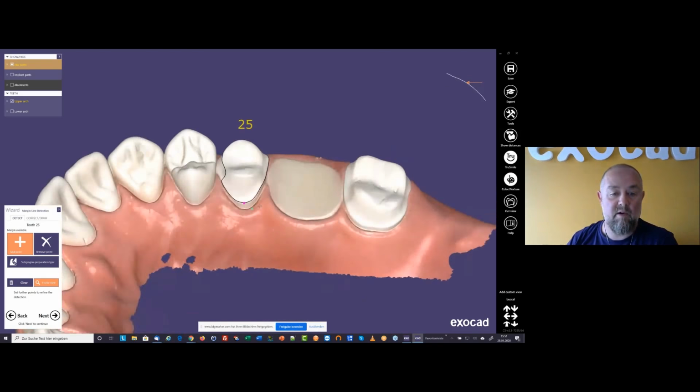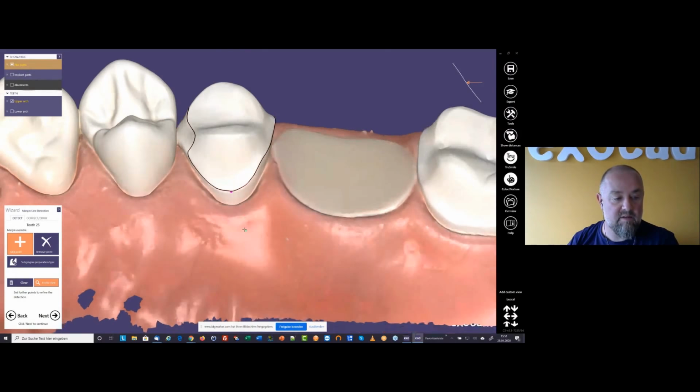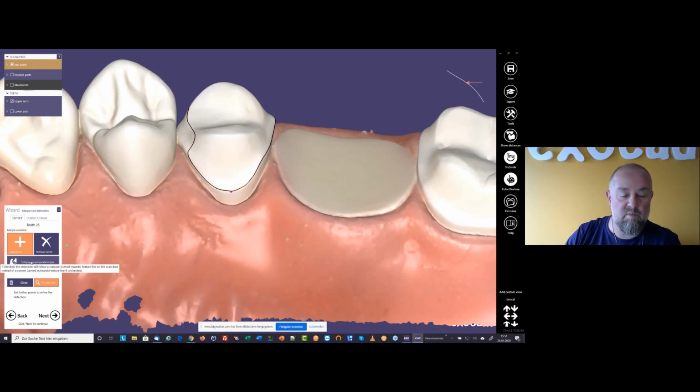So, and here you also have to take a decision. For example, in an intraoral scan, it might happen that you have a subgingival preparation type, which means that your preparation is below the gingiva. Then you should use different algorithms to detect the margin. Then you can click here on this button, and it will change the mode of detection. Then you also have to define 4 points, and then the software will search for these concave areas to detect the margin line. I will not show that now because it will obviously not work with that case.